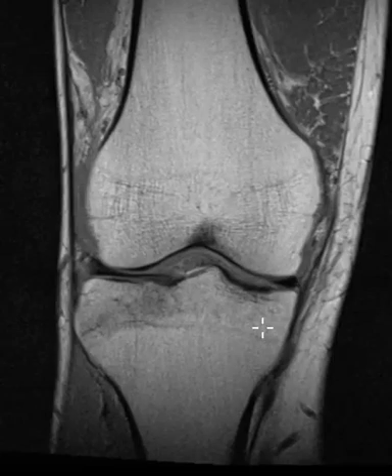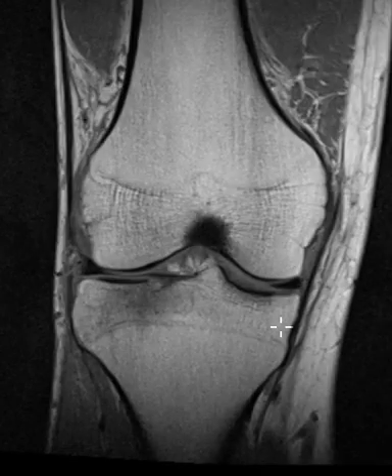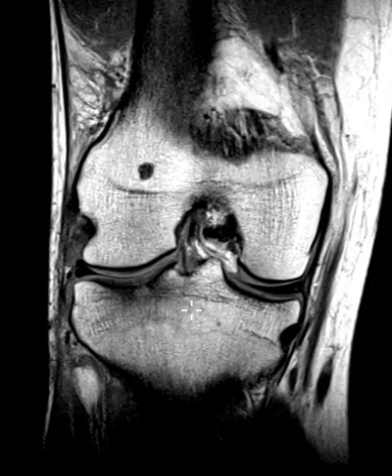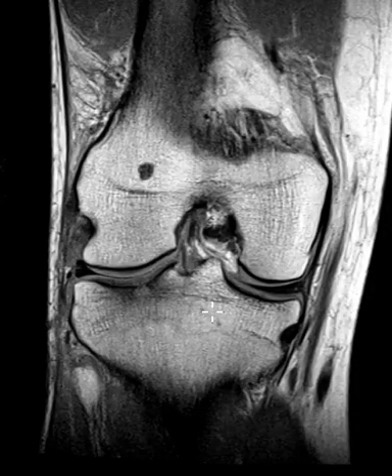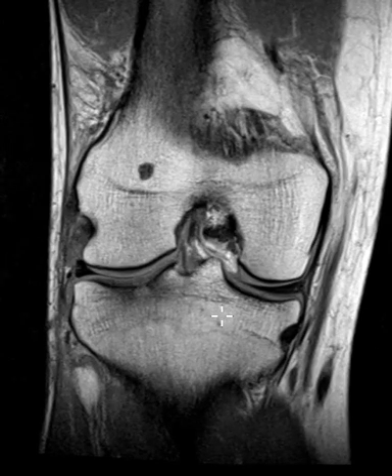This is a 46-year-old male with complaints of knee pain. They went to the orthopedic surgeon and had no history of prior trauma, but just bad knee pain. They drained off some fluid from the knee, but then the fluid came right back. After that, they decided to do an MRI to see what was going on.